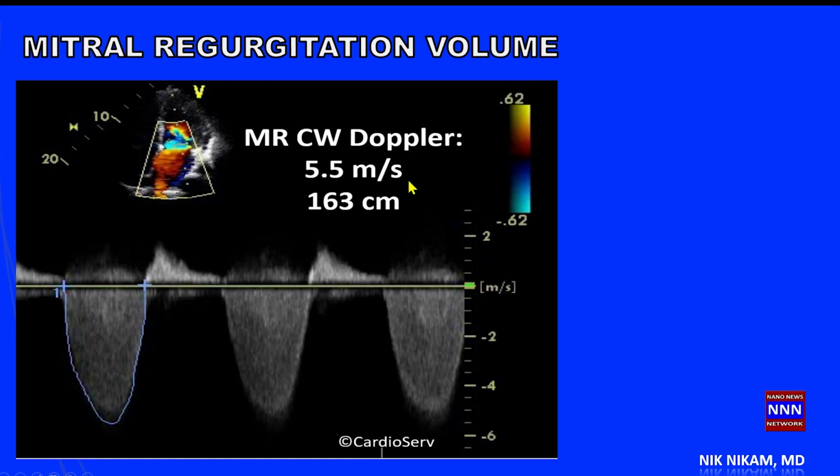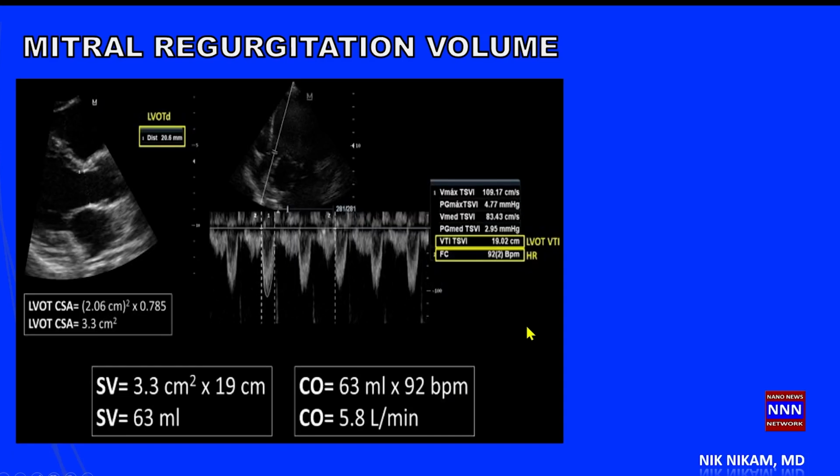Keep it in centimeters, that makes all the calculations easy. And 163 is the velocity time interval, or integral. Let's move on to another example here.